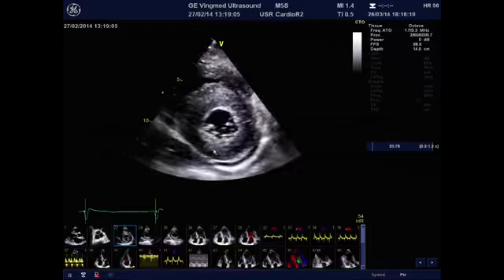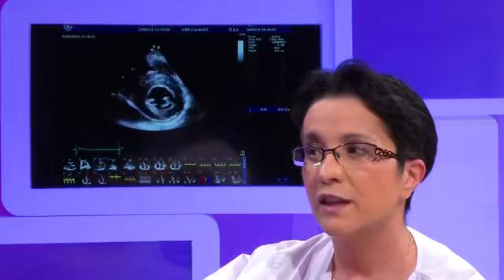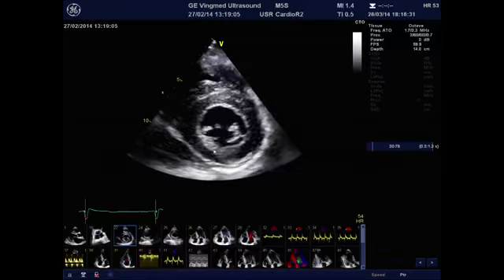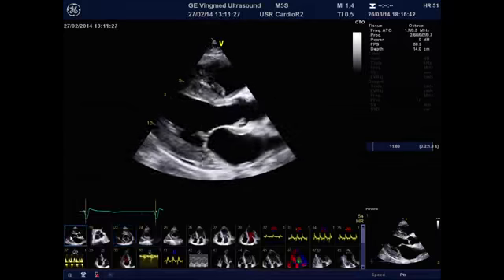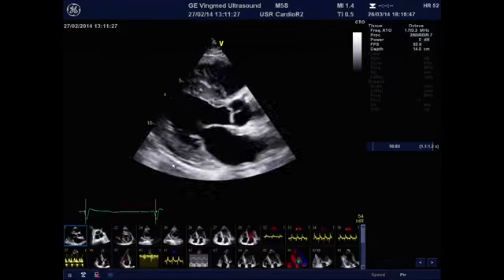As a characteristic of amyloidosis, there is a low voltage to mass ratio, meaning that even if the LV walls are thick due to infiltration by amyloid, as you see in these echocardiographic images, the ECG shows a low voltage of the QRS complex. This is typical for infiltrative diseases like amyloidosis. You can also guess, both in this image and in the previous parasternal long axis image, that there is a small pericardial effusion, which is also a typical feature of cardiac amyloidosis.